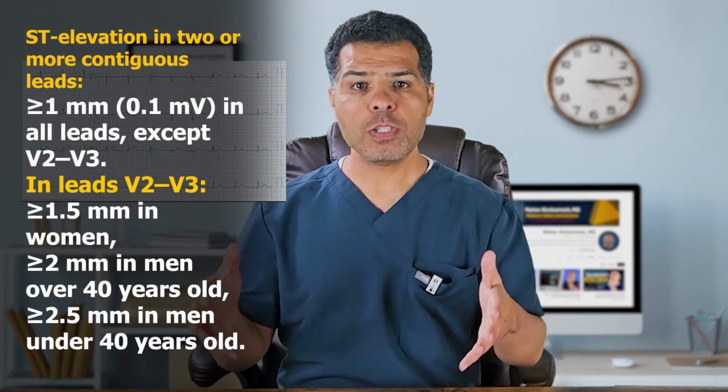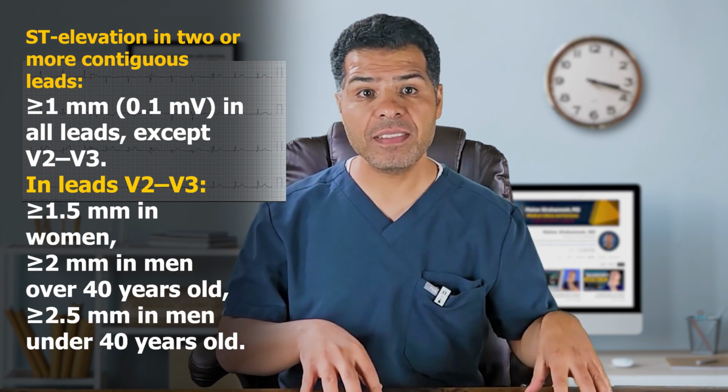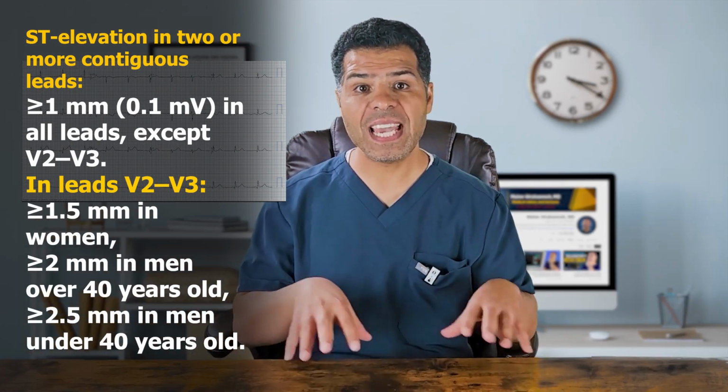And according to the American College of Cardiology, to call it a STEMI, you must have the criteria shown here. Of course, our patient met these criteria and the cath lab was immediately activated. The patient had 100% RCA occlusion that was opened and stented.